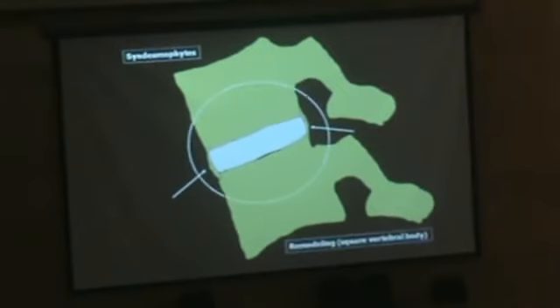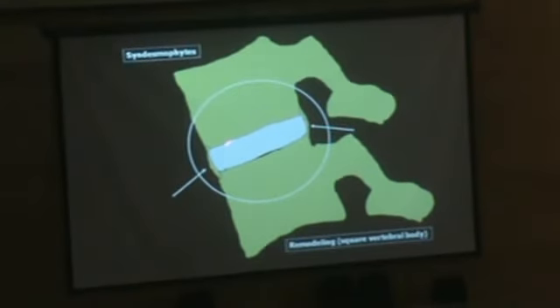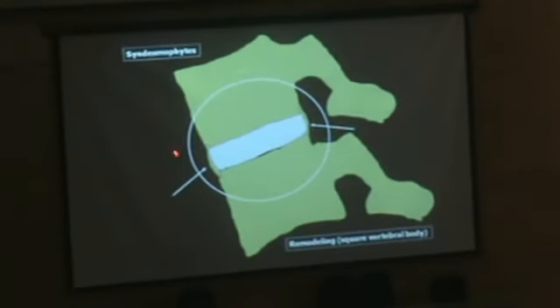This is a very important feature when assessing any exam from a patient with suspicion of spondyloarthropathy, not only ankylosing spondylitis. As well, we can see some remodeling of the anterior and posterior corners, and we're going to have this feature that we see often on every imaging method, which is the square vertebral bodies. And this is a very important feature as well.